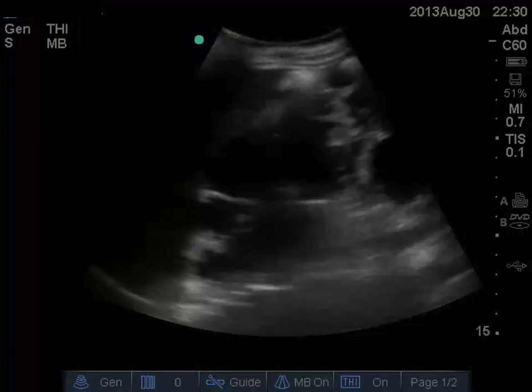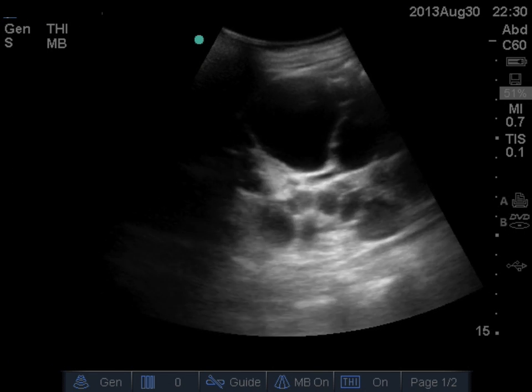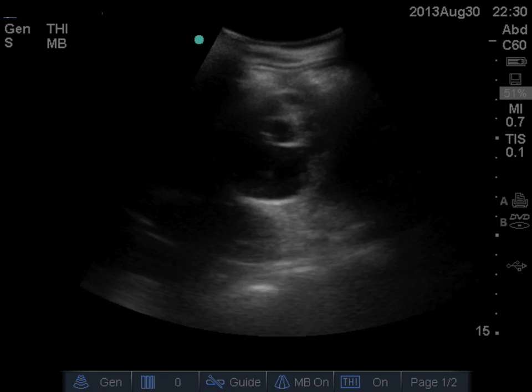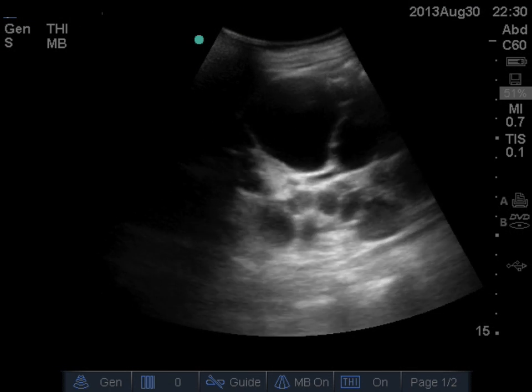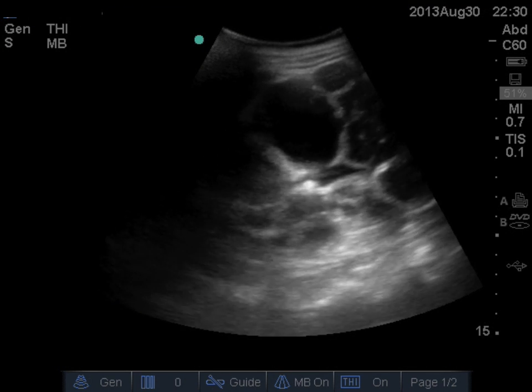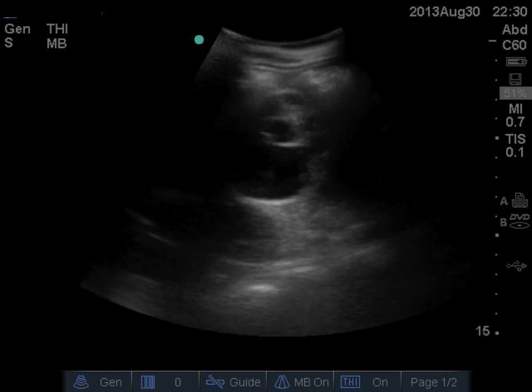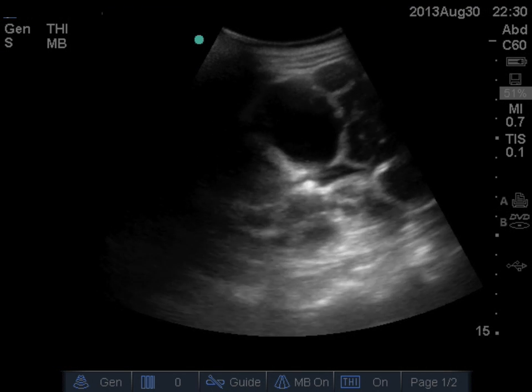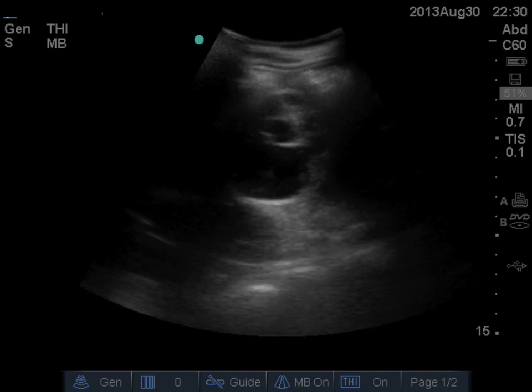They can be so big, though, that this is actually a significant case of polycystic kidney disease. The normal renal architecture is pretty much tucked down here, and then you just have a continuation of dozens of cysts that continue on up as well. Okay. I don't have any examples of any renal tumors that were that great.